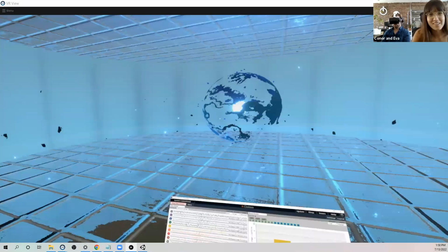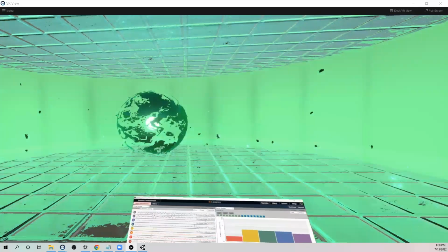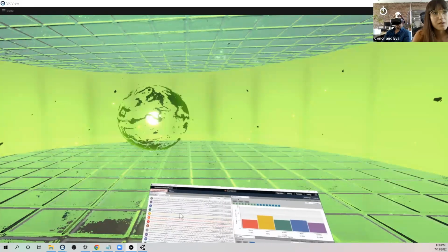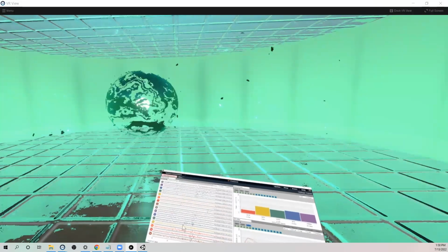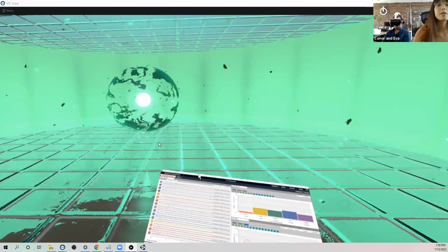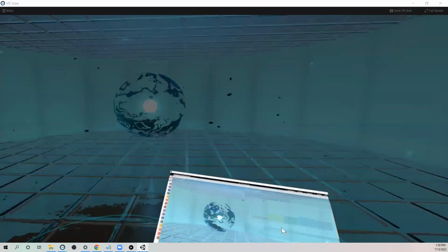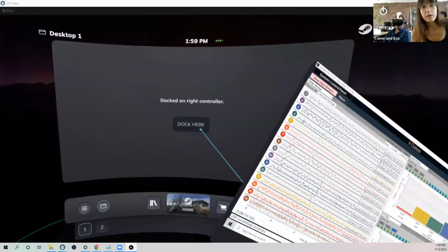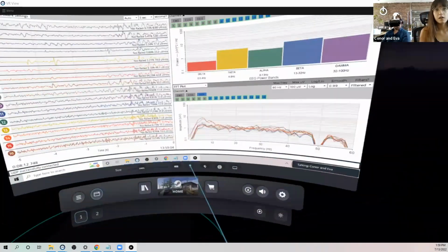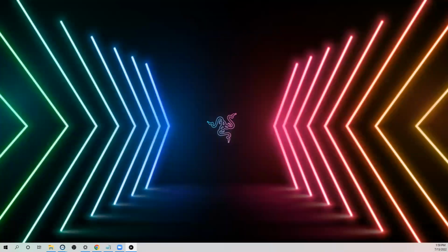Yeah, let's do it. All right. I'm gonna take the lead. I think we've actually got a lot of questions to run through. Okay, it might be good to stop to go through a couple of the most upvoted questions at this point. Can you hand me the mouse? Where is the mouse? Here, let me dock it again. Yeah, it'd probably be good to shut down the VR itself at the moment. Right. Docked. Or I can even just pull up the regular GUI. Yeah, that would be easier to see if you pull up the regular GUI.